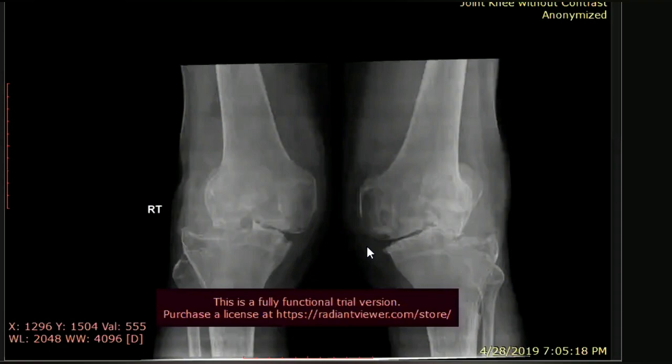First you say what the diagnosis is, not what it is not. If you describe the X-ray, you will say that there are changes of erosive arthropathy at bilateral knee joints, nearly symmetrical, with subluxations, large erosive changes and soft tissue swelling. So erosive arthritis at bilateral knee joints.